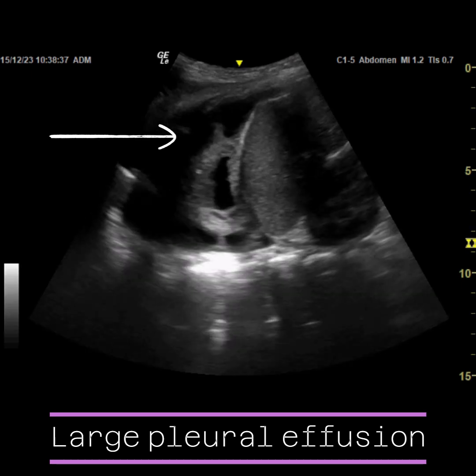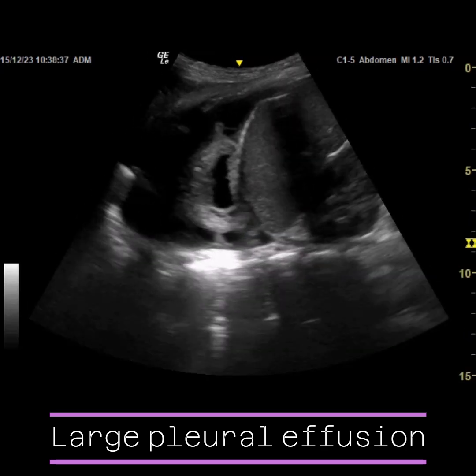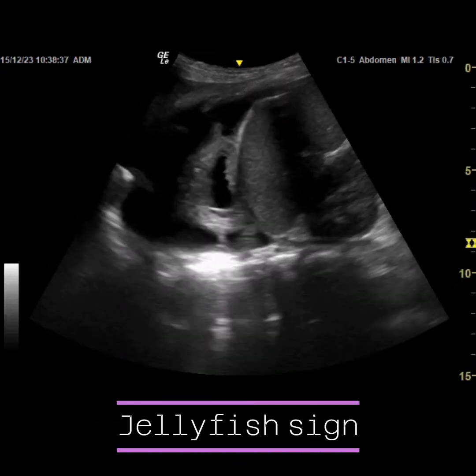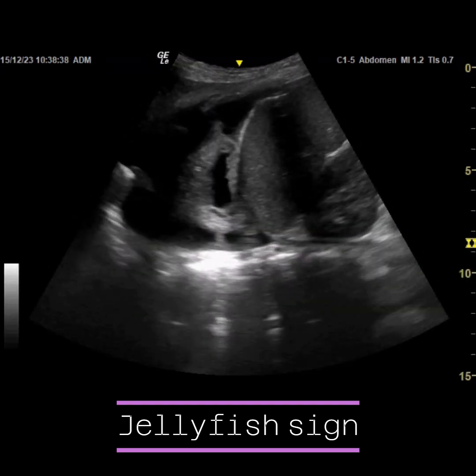The effect of the fluid in that pleural space causes the lung tissue itself to collapse down, and this can produce some very unusual appearances as shown here. The term we typically use for a collapsed lung flapping around within the pleural effusion is called the jellyfish sign.